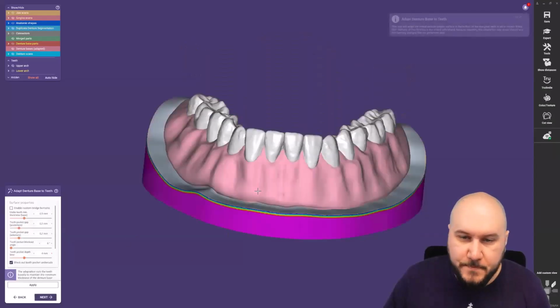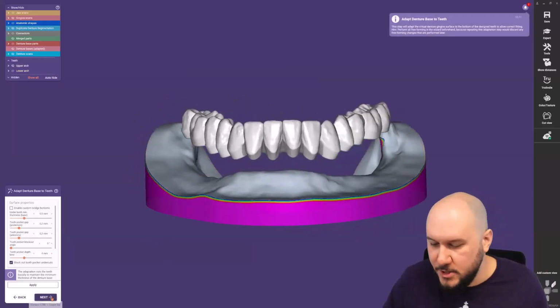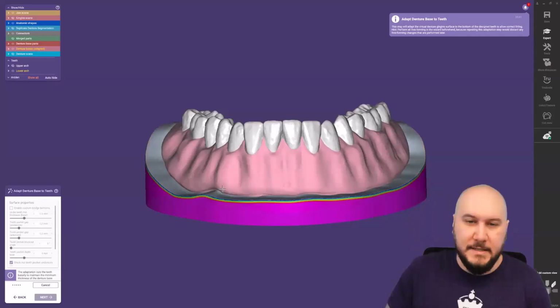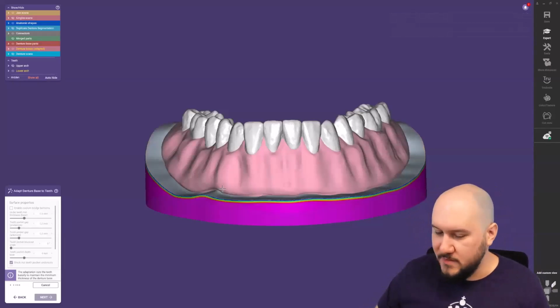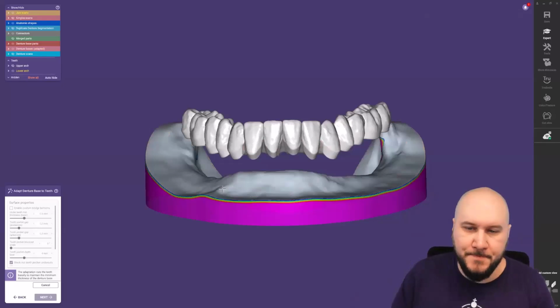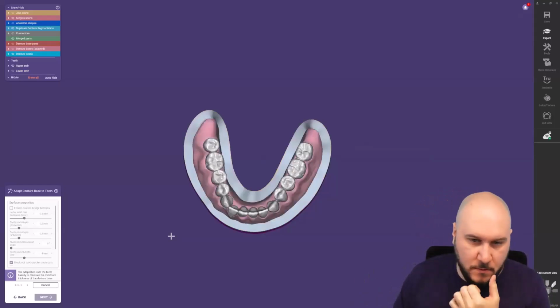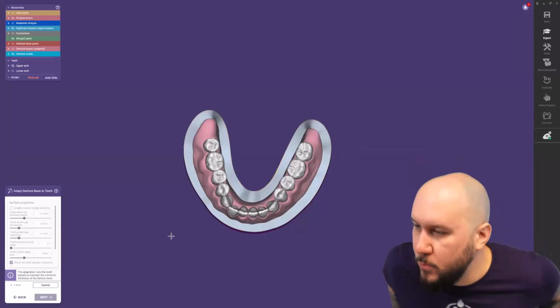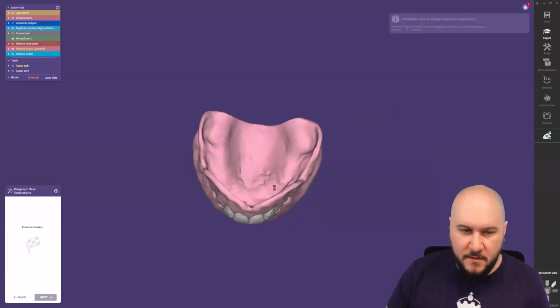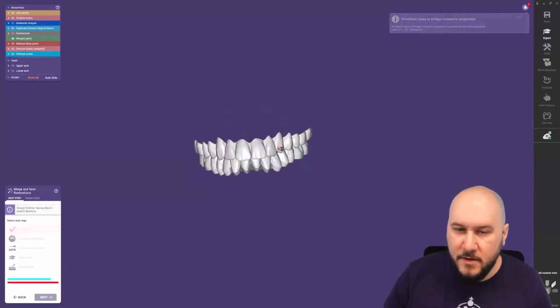Enable custom bridges. Exactly the same now here for the bottom part. We can enable it, but during the calculation time, we'll just skip it in this case, because I think we just have 90 minutes left. Talking too much again, and I don't want to waste that much time doing the calculation, because I just want to demonstrate the next case also. That's why I really need to go forward. So the next case will then also be set up. And now, like you see, we have set our different kinds of model parts.